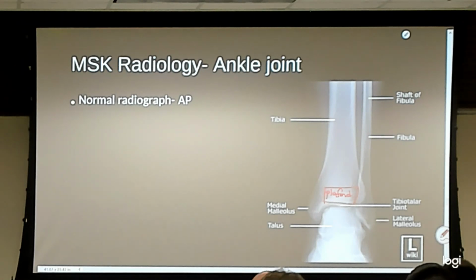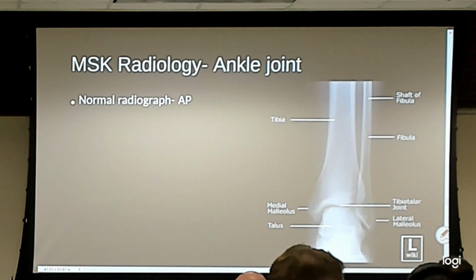It articulates only with the talus, but in a pediatric patient who has physis there, an epiphysis, it becomes important to the articulation with the talus in terms of developing osteoarthritis and stable and unstable fractures. Anybody else need me to outline anything before we move on to the lateral?